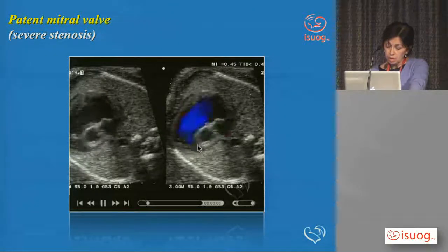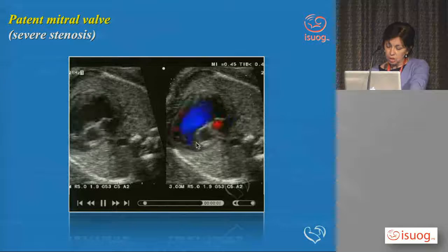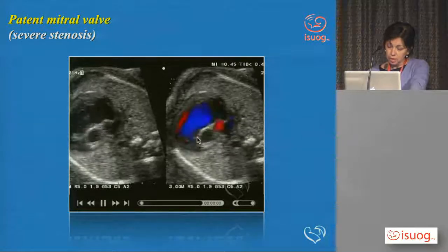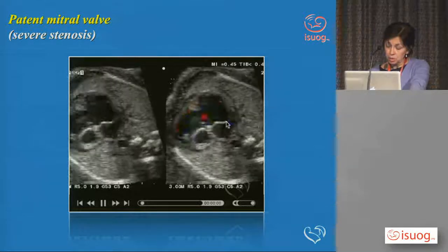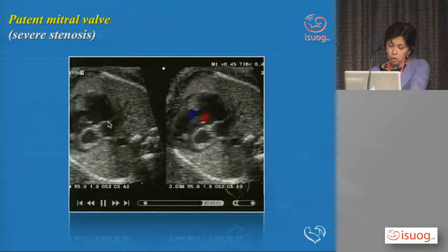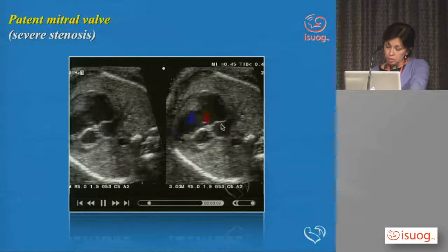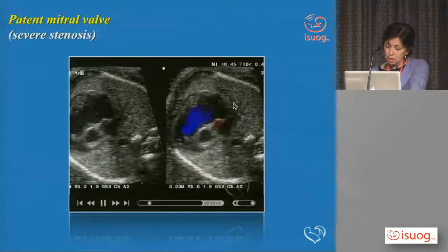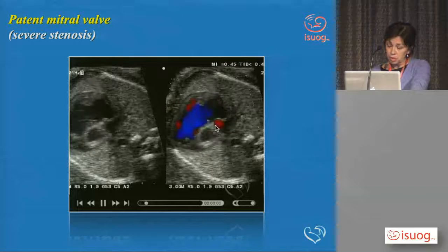So contractility is impaired, the size is there, it doesn't actually contract at all, doesn't change its size. It's very bright, probably reflecting areas of endocardial fibroelastosis. If you look at the atrial septum, it's quite thick compared to a normal heart, but you see here on the color there is still a little bit of left to right shunt, and then you would have to do studies in the pulmonary veins to try and ascertain the degree of restriction of the atrial septum.